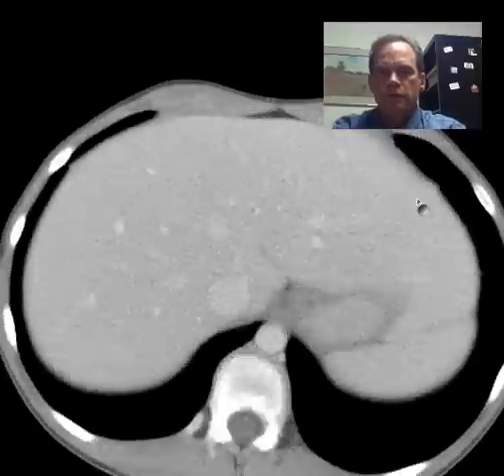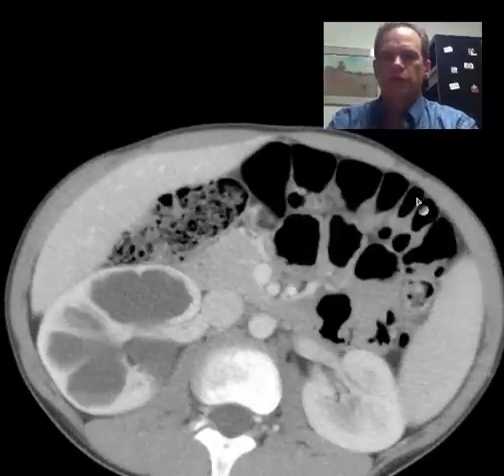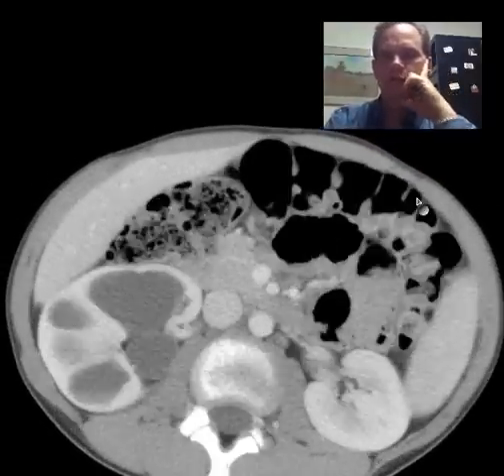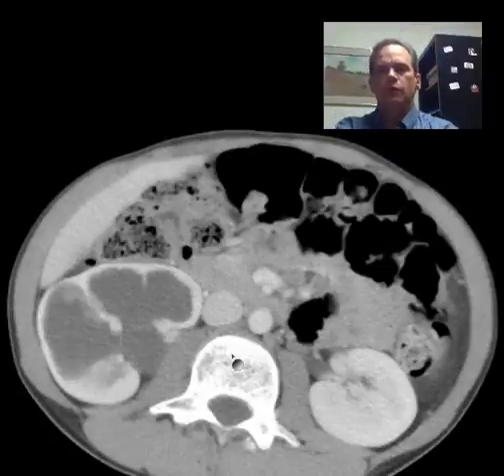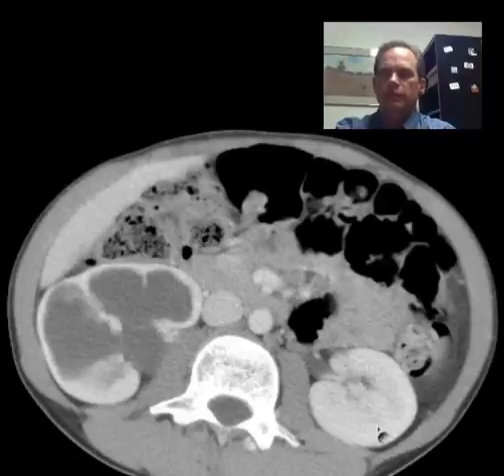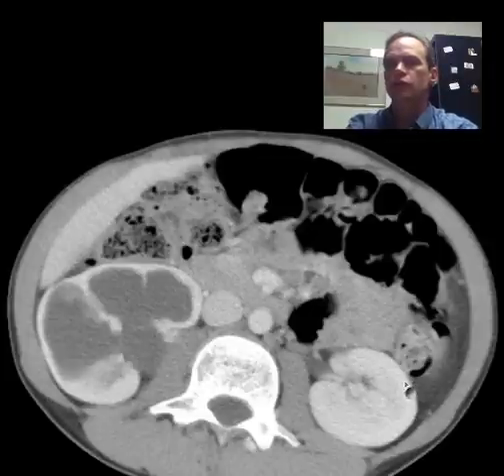Now, this is a relatively common disorder that we are usually very impressed by when we see it. Now, this is very asymmetric, right? What is asymmetric? Okay, we're looking at kidneys, and we say this left kidney shows very uniform distribution of contrast, which means it's gone beyond the stage of the case that we just looked at where we had cortical enhancement but no medullary enhancement.